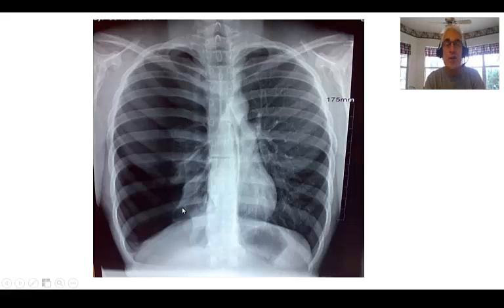So we've explored the airway, A, B, the bronchioles, or the bones, C, the cardiac shadow, D, the diaphragm, E, effusions, F, free air, G, gastric bubble, H, hilum, and I, interstitium, looking at and interpreting the chest x-ray.